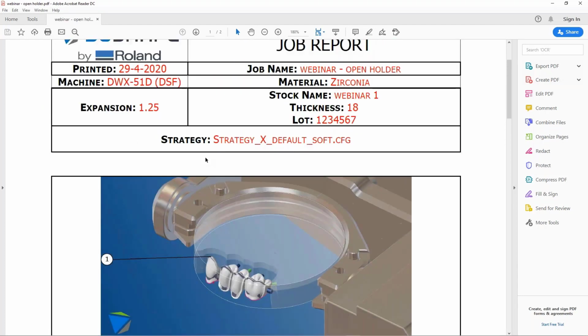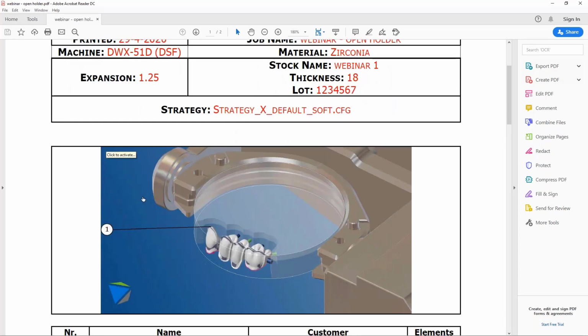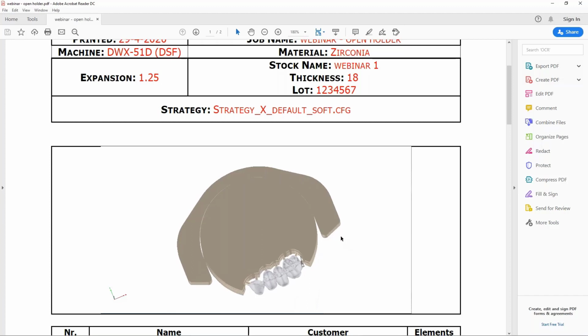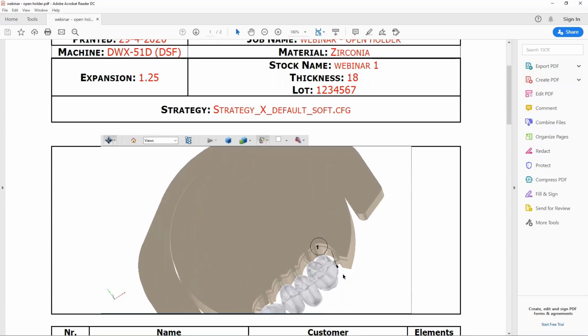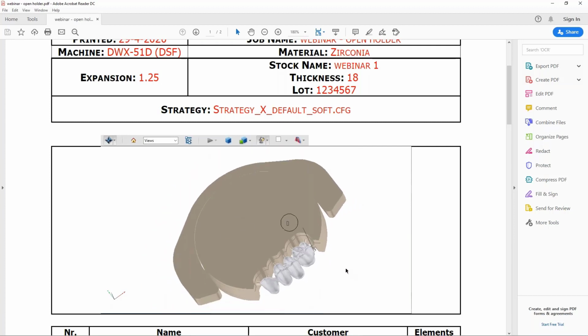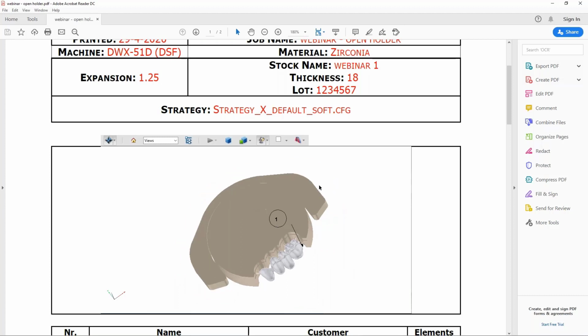And also the particularity in this PDF management, only PDF it works, is the possibility to see 3D, in two-dimensional real-time 3D PDF. So you can see the object in real time, okay? So you can analyze it. And this kind of document, sorry, can be sent to your customer, to anyone who needs to check this kind of document without showing him the machine. So it could be very easy and useful in order to share some information about the future milling.